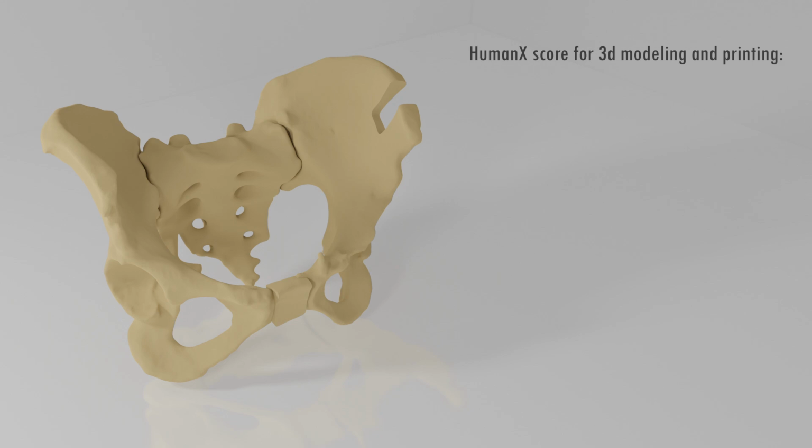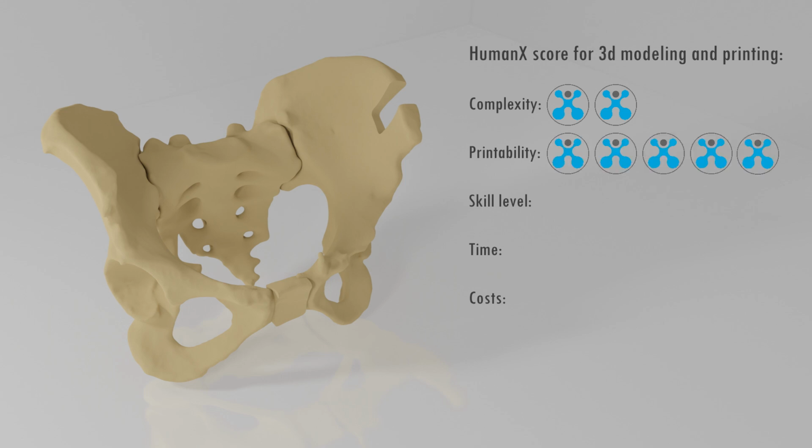A look at our HumanX score for 3D modeling and printing shows that the model is very well printable. As the bony structures are easily identifiable on CT, the segmentation does not present any major challenges. Due to the size of the model, a longer printing time can be expected. This must be taken into account with regard to the scheduled operation date.